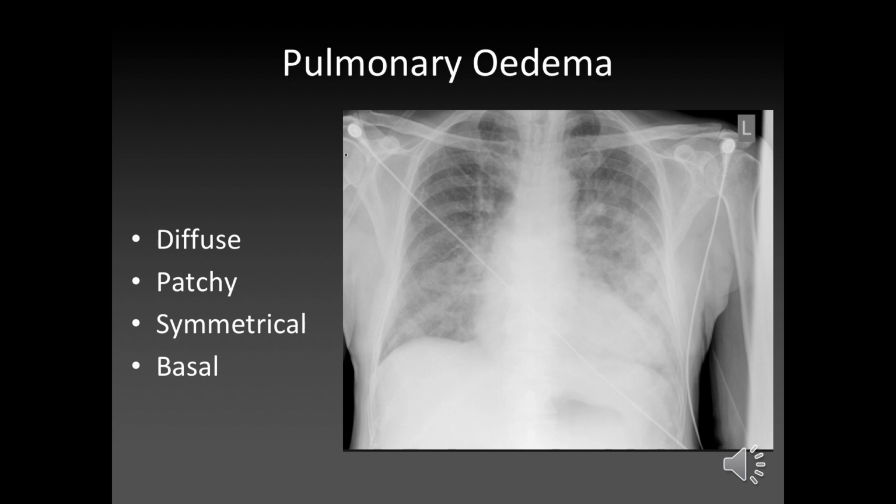And that's pulmonary edema. So pulmonary edema, like we said, fluid in the lungs. Obviously, if you put fluid in and you stand the patient up, it goes down to the bases, hence why it's all basal.